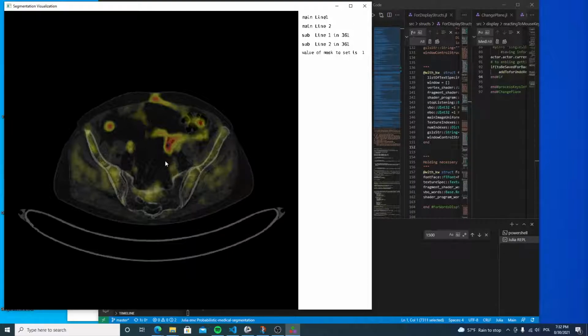What is also important, the smaller the range of values, the stronger the signal would be, because we would divide the values by the small range. So as you can imagine, when we normalize the data, we divide by the value range.